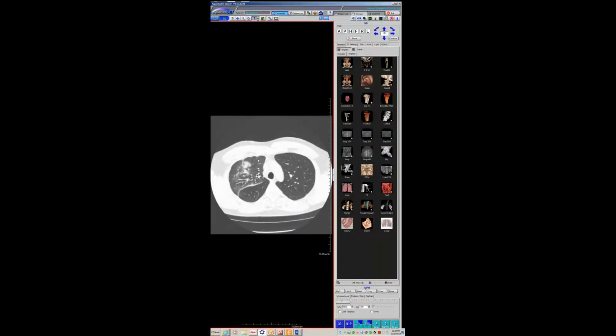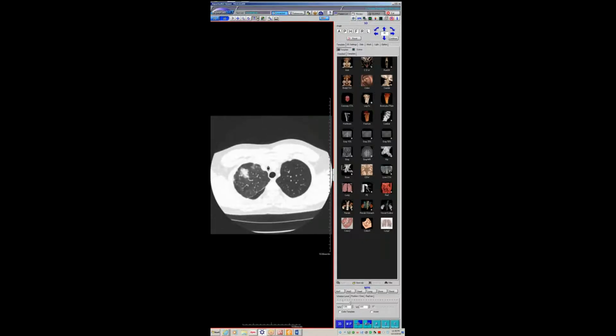Again, the septal thickening. And they showed this to me in a conference, and then here this is a different area. So the other area is resolved. Now we're seeing some curvilinear density. So I looked at this, maybe even some central clearing, and said this is going to be hemorrhage. And again, you can see the density of this right upper lobe compared to the left.